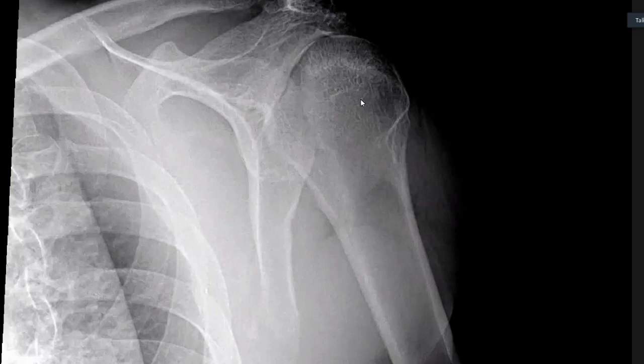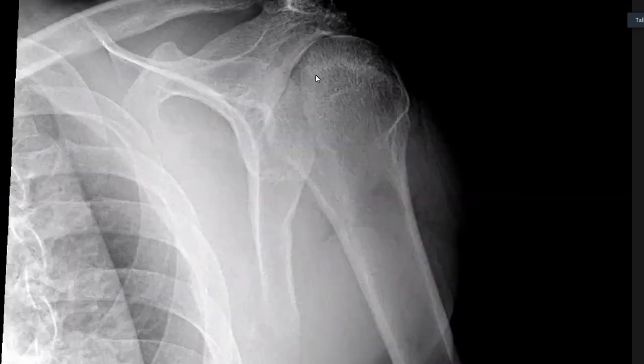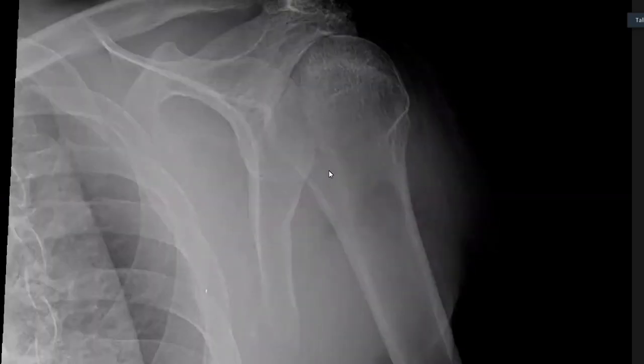So if you imagine, the humeral head has gone back. There's this big indentation of the humeral head. You see a flat line. If it was completely off, you shouldn't see that line. All of you can see that line. I want you to keep this image. I don't know whether you have seen it before. I've seen it probably 3 times in my last 12 years on X-ray, right? So what we are seeing here is posterior dislocation with a large impacted anterior Hill-Sachs, right? Okay, now let me go back to the CT now, just to highlight that.